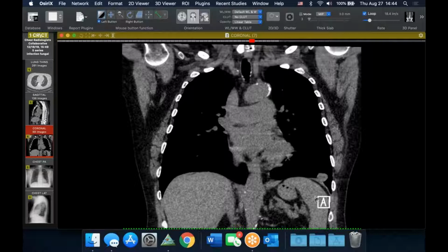And I know Dave is going to ask me which species, and we don't have that because it was not grown out of culture, but I think they did some kind of PCR on it or an antibody to it. But either cryptococcus, probably neoformans out here, but there is gattii too, and either can occur in transplant patients. And this was interesting. I didn't save the other images, but it had actually persisted over several studies, even with treatment.